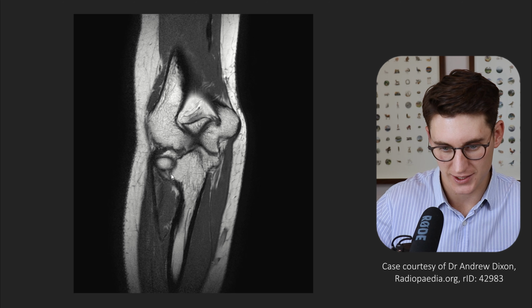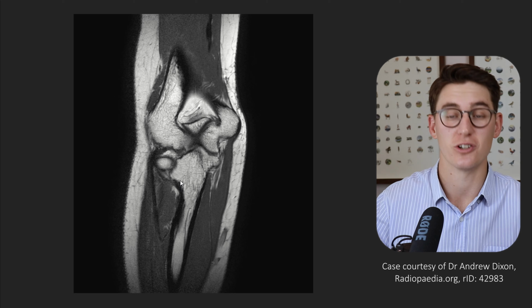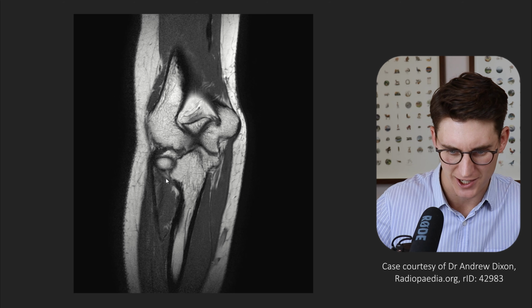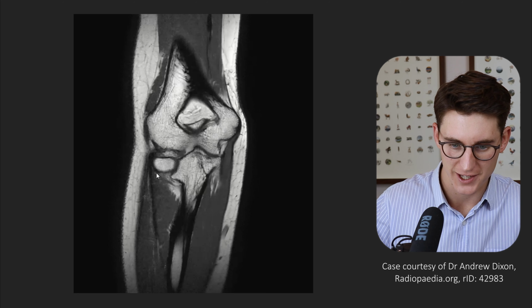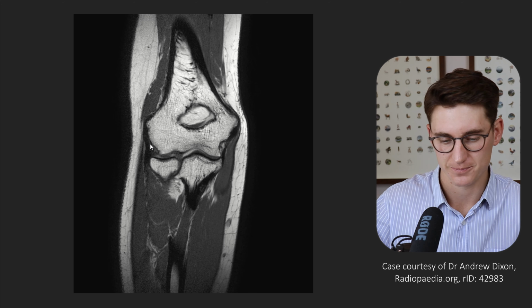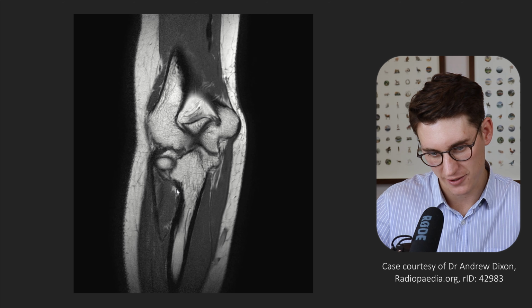We can see it here. This part of the ulnar bone is what's known as our supinator crest. We're going to look at the supinator muscle that comes off here. And we can see this ligament heading out superiorly and laterally, wrapping around the radial head and then heading up towards this lateral epicondyle here. So we can follow it. Let's follow it down, and we can see it coming down into that ulnar bone there.